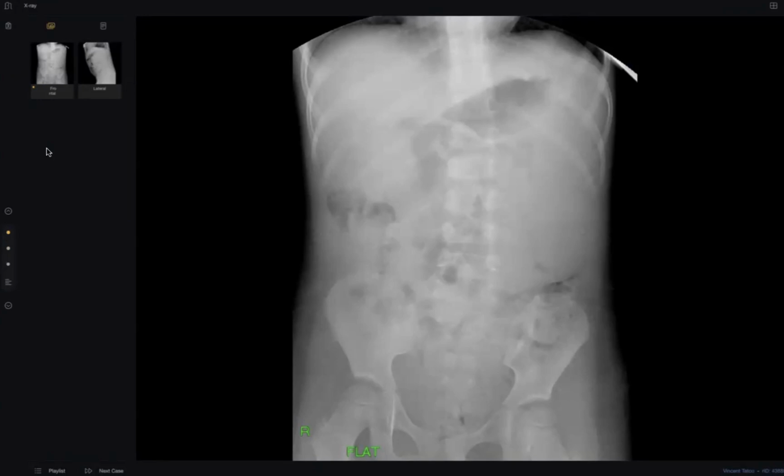A 5-year-old female patient with a painless mass in the abdomen. Sir, I'm provided with the X-ray KUB, abdomen frontal projection. I can appreciate a homogeneous density overlying the left renal area, causing displacement of some bowel inferiorly, and I can't appreciate the renal shadow behind it. It's a homogeneous smooth density on the left side with minimal scoliosis of the spine as well.